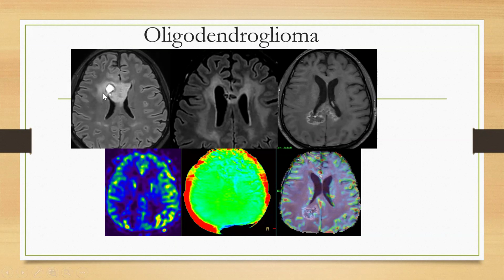Just this one type of tumor is a corpus callosal tumor. This is post radiotherapy. The tumor almost melted. This type of tumor will melt and a significant response was there. But in the follow-up period, we are seeing some necrotic changes in the posterior corpus callosum.